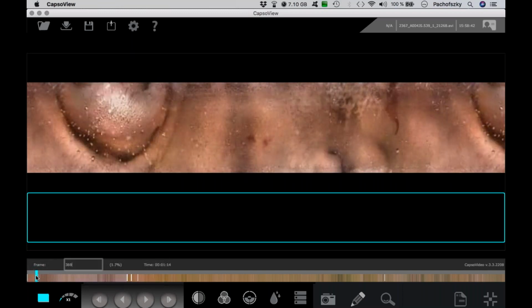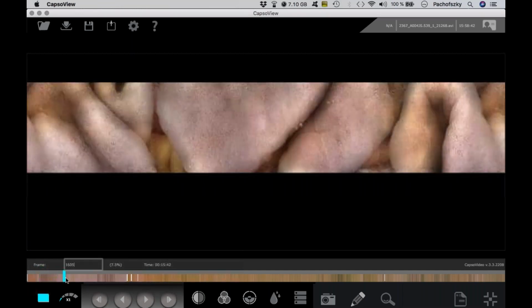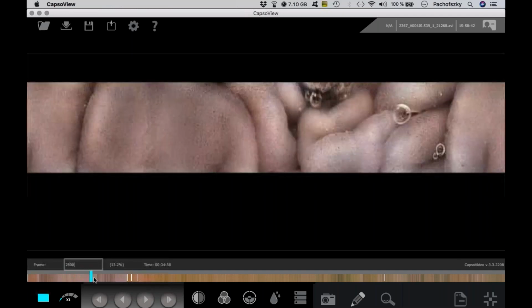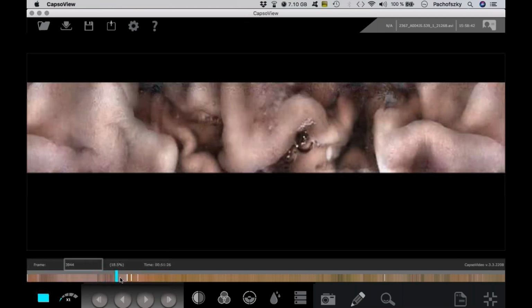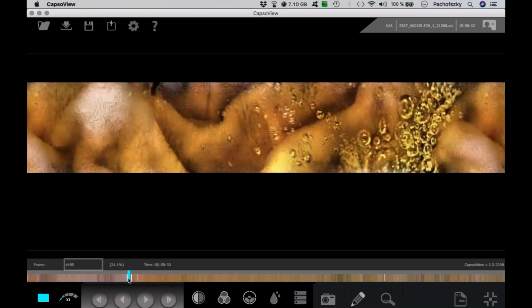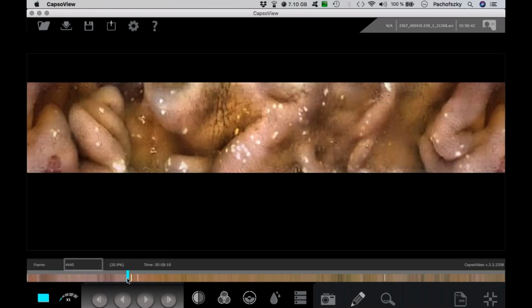You can see here in this area in the stomach, there are some red spots. We will look at them later on. Then you can also see here, we have a change in the color. So we're looking at what's going on in this area. And you can see really there is the change from the stomach to the small bowel.